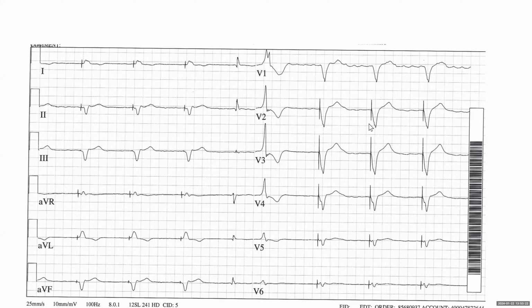Okay. We have here CRTD. Is this a CRTD? Probably not. And I would say, one, it's not in the code anyways. Two, if we don't have an X-ray or history, the way we tell if it's CRT or not is by the morphology of the QRS.